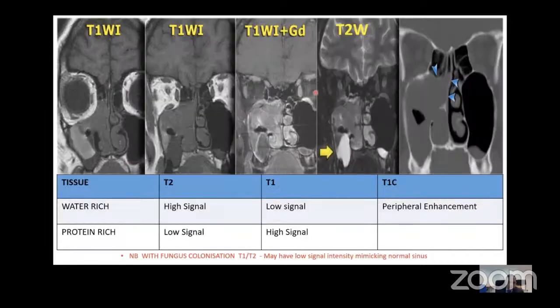Now, when we come to the sinuses, we may have a lesion which can fill the nasal cavity and can also obstruct the sinuses. This will lead to retention of secretions, which can be of fluid nature or very proteinaceous, thick, inspissated nature. So how do we differentiate on a scan between these three parts?